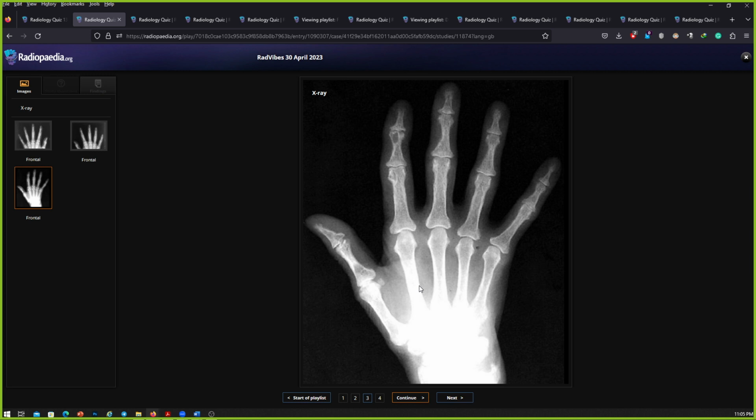If it's a new case, I'll recommend correlation with the parathyroid hormone level and an ultrasound scan for the thyroid and parathyroid region. I'll check clinically why the patient came and if there is any localized pain or what the clinical concern is. However, I can't see any fracture here.